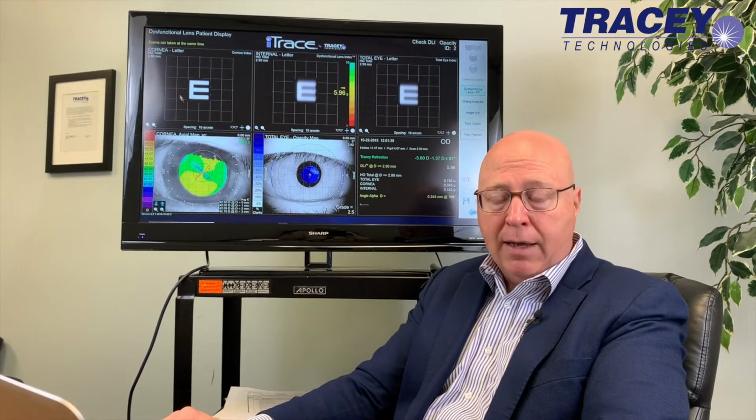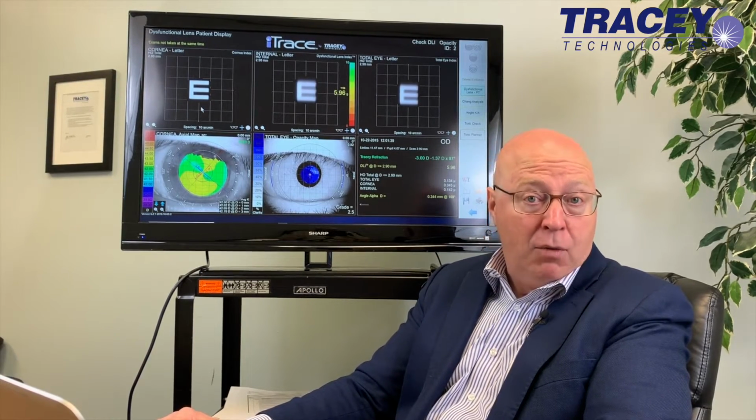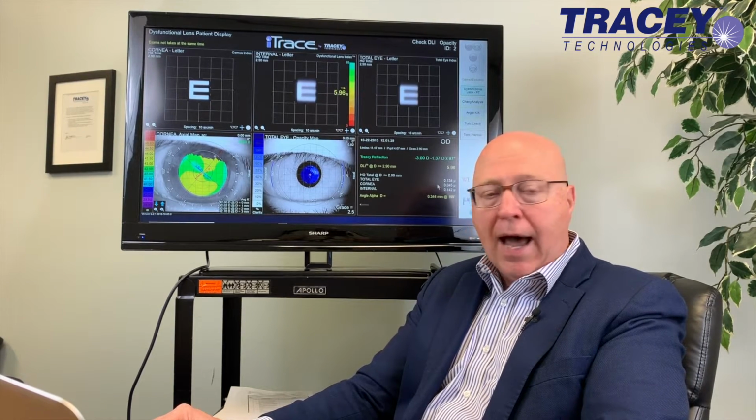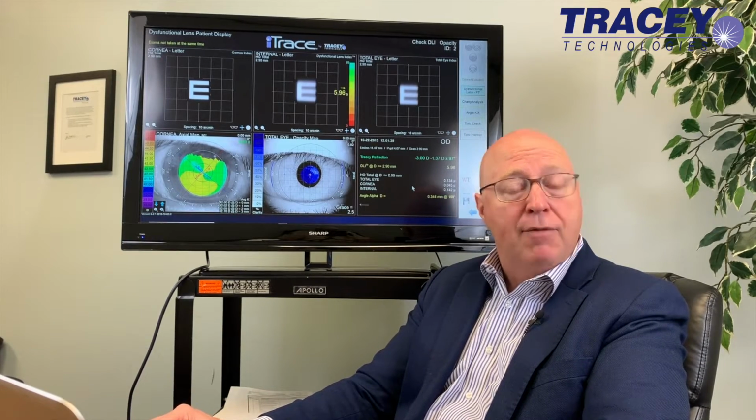Well, first, you can look at the cornea qualitatively. This Snellen-E represents the best optics the cornea can give. This is actually quite good. You can look at it qualitatively, or down here under corneal high-order aberrations, you can look at it quantitatively. It's 0.05. If it's 0.15 or less, you're probably okay. If it's more than that, you're probably not okay for a multifocal.